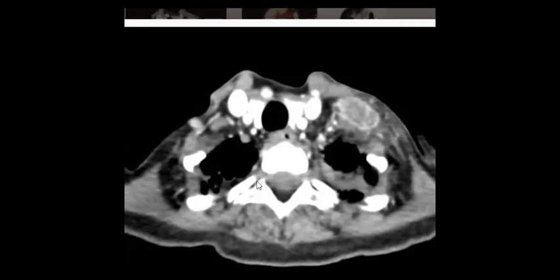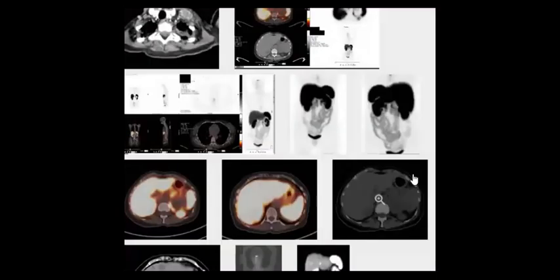And do you agree that you need to see the lung? I see, Marwa and Nermeen, that you need to see the lung. So let's shift and see if we find some. Okay, I don't think that he has any lung here.